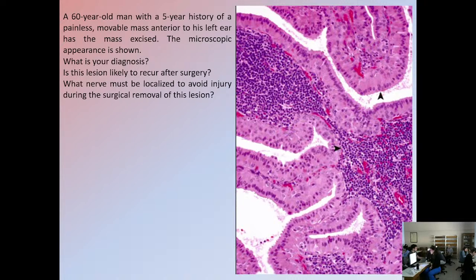So another neoplastic cell type with increased pink cytoplasm is oncocytes. These are not squamous cells, but keep it in mind. If you see neoplastic cells with pink cytoplasm, you can think of a squamous cell carcinoma, this is squamous differentiation, or you can think of an oncocytic tumor, such as the case here.